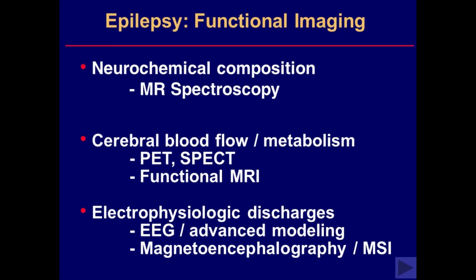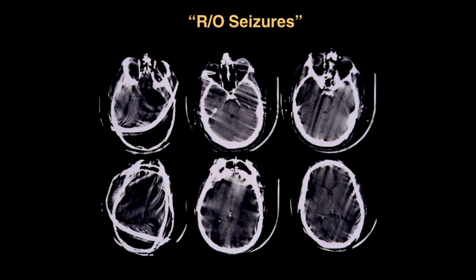with the whole picture. Now, sometimes we can help put that picture together with other functional type imaging modalities. So let's look at some of those and glean what we can from a more comprehensive anatomic and functional look.